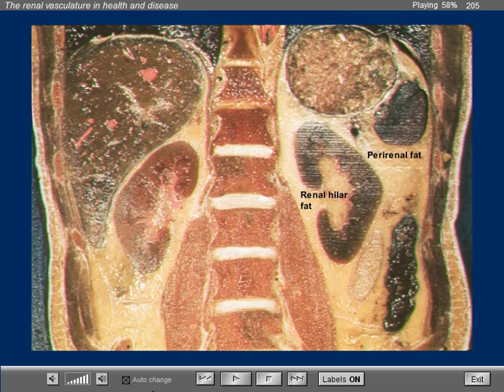As a matter of fact, if we see excessive fat within the kidney of a patient with an extrarenal pelvis, we must suspect a pathological condition. Excessive fat in the renal sinus may be an anatomic variation, but also may be seen with inflammatory and other processes of the kidney.